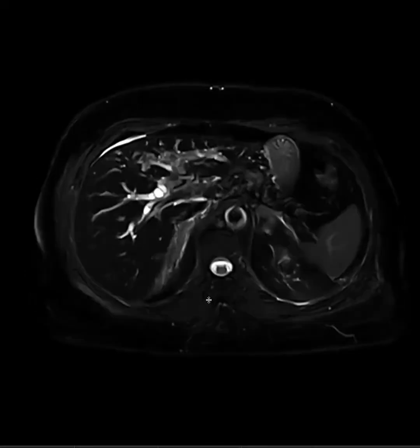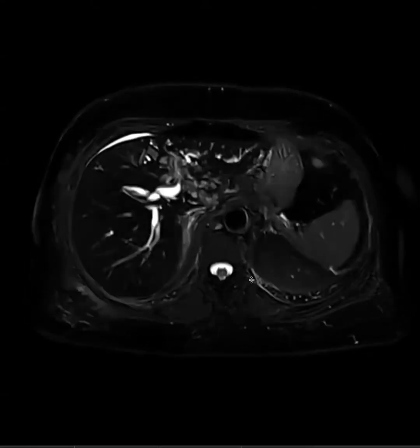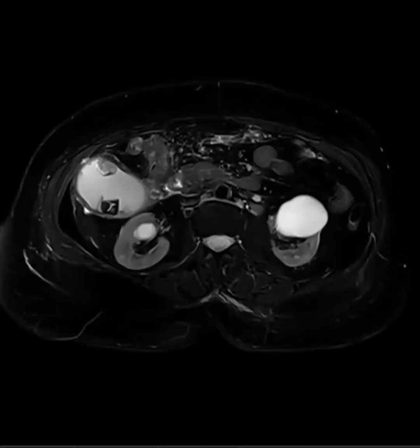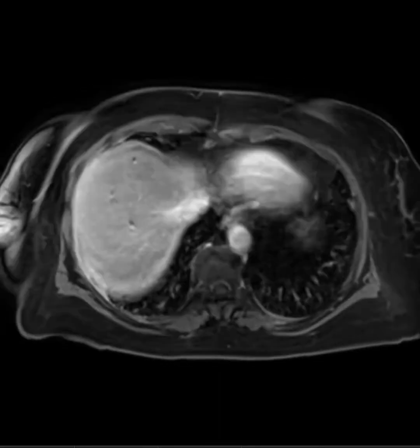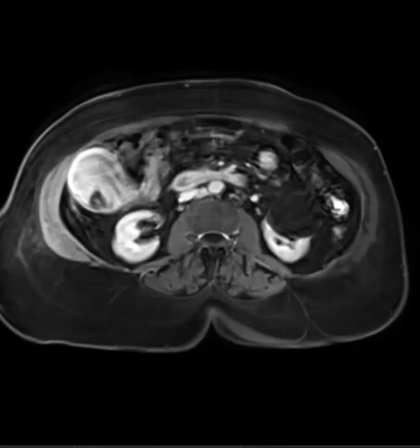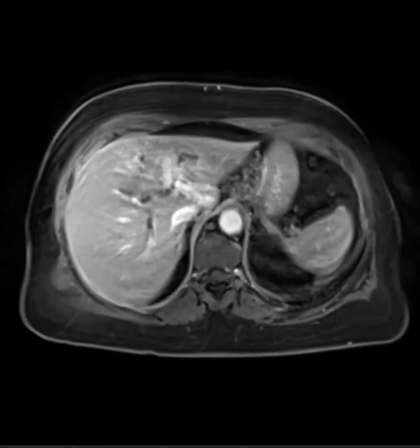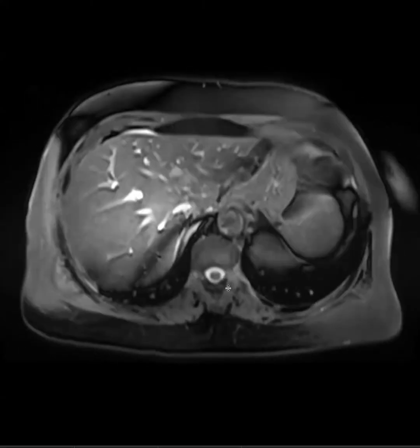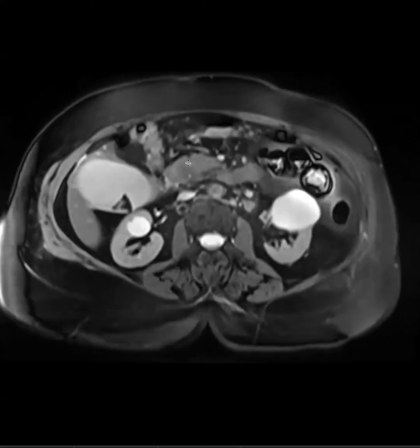Yeah, there's just like a lot of abnormal gray tissue in and around the ducts. Yep. And so I would think this is another IPNB, maybe. I think, okay, and then actually the patient also had extrahepatic findings. So here there's a large abnormal lymph node. There's like hypoenhancing. Let's see if I can find that lymph node here.